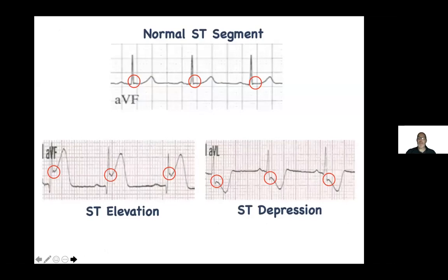Upper example, you see that the ST segment is essentially isoelectric. And when I teach my courses, I usually use the term isoelectric-ish, because none of us has a perfectly isoelectric ST segment, and some deviation above or below, as long as it's less than a millimeter, and it's usually less than a millimeter, and it's not in contiguous leads, could very well be a normal variant. It could be a normal pattern for that patient. Of course, it could be lead placement as well.